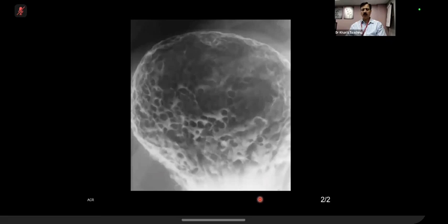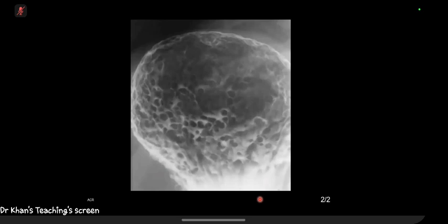So how do you explain this finding? Okay. So I can see there are multiple filling defects noted in the stomach, along with the contrast uptake surrounding them. So in the stomach as well, along with the colon. So that's the polyposis syndrome again.